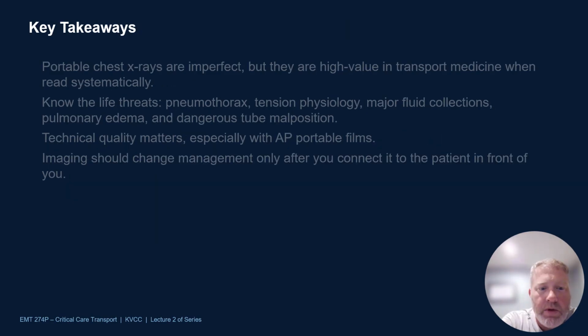And to wrap up, portable chest X-rays are not perfect by any stretch, but they do offer a lot of value in transport medicine when you read them systematically. Please understand the life threats. So, pneumothorax, tension pneumo, big time fluid collections, pulmonary edema, hemothorax, things like that. And then whether or not the tubes, endotracheal or otherwise, are in the correct spot.